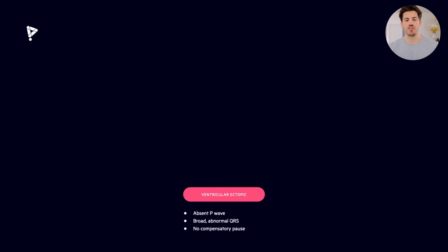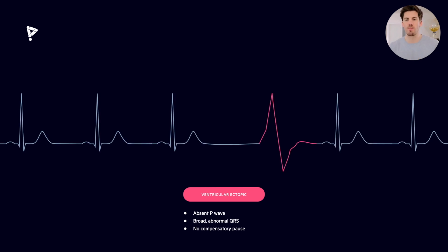And then finally, with a ventricular ectopic, we have an absent P wave because a P wave is reflective of sinoatrial node atrial activity going through the atria. So in this case, it's occurring in the ventricles. We get no P wave. We get a broad abnormal QRS because we're getting a slow wave of depolarisation throughout the whole of the heart, and there's no compensatory pause.